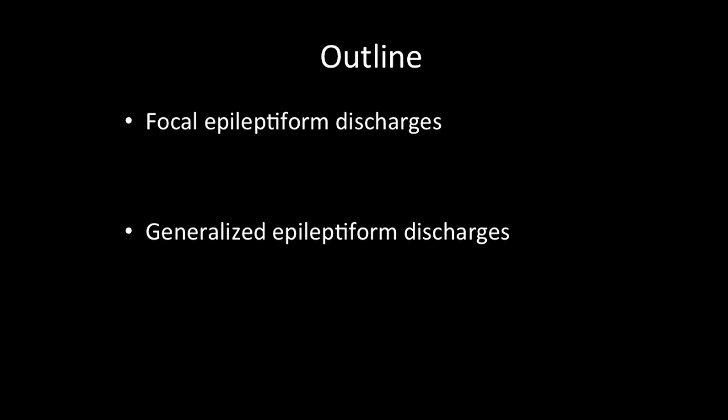In this video, we will review the basics of interictal epileptiform discharges. Specifically, we will look at a few of the most important characteristics of focal epileptiform discharges, and then we will briefly review one type of generalized epileptiform discharge. Hopefully, this will provide a basis for some further learning about epileptiform discharges and epilepsy in EEG.